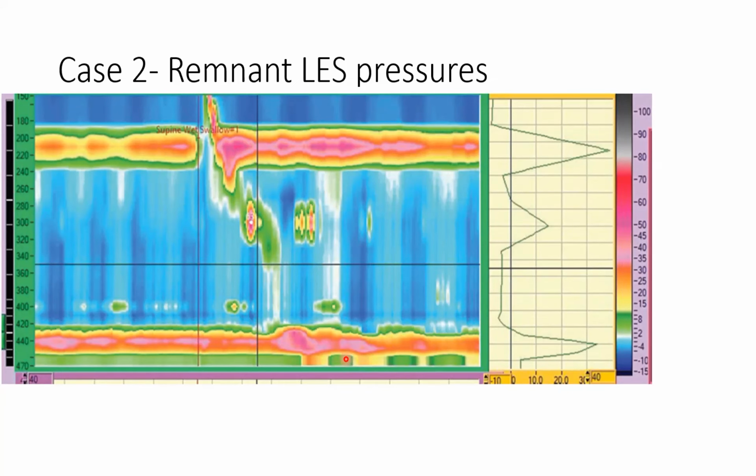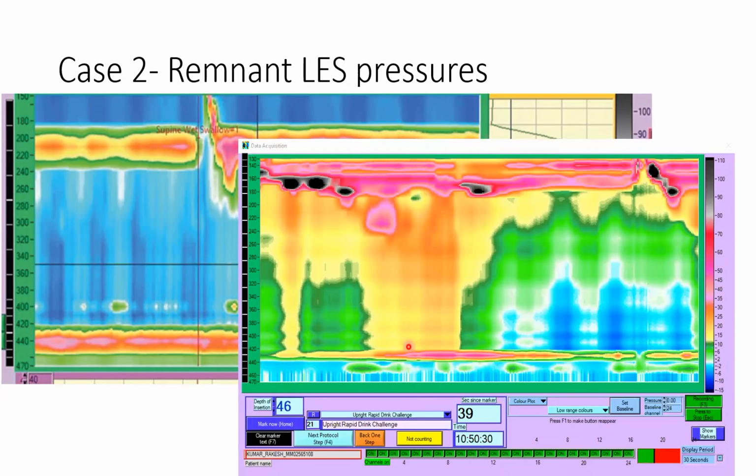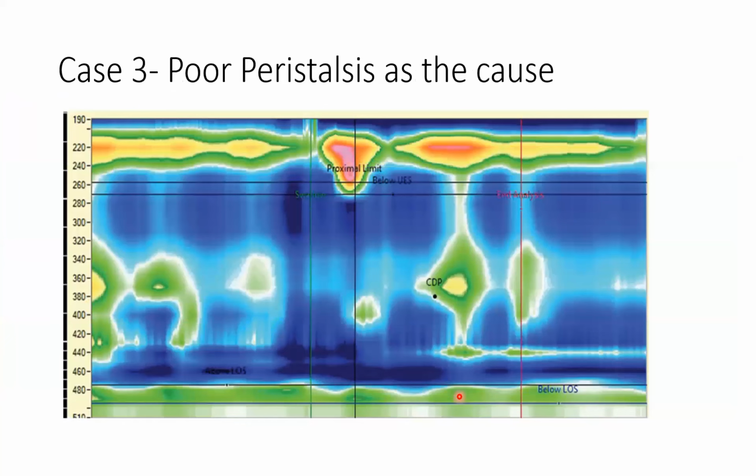Here again, some muscle is left. Here again, you can see some muscle is left on this side also, and it is showing some amount of pressurization. So these cases will definitely require a redo of the LES.